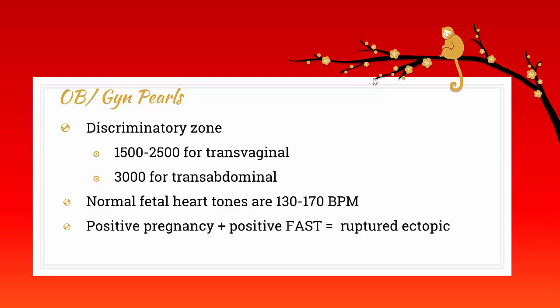All right, moving on from trauma and FAST, let's go ahead and discuss OB/GYN. So when it comes to OB/GYN and questions and ultrasound images on board exam, it's a pretty safe bet that most of the questions are going to be related to ectopic pregnancy and frequently involve management of these patients.